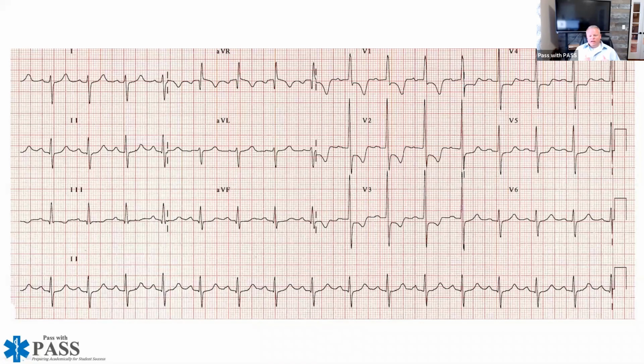So if I were to give you this 12 lead EKG, or you make a run today and pick this patient up, what would you call in with? You probably would call in with, hey, I'm bringing you a patient that has some basic ST segment depression, telling me that I've got some hypoxia, or the patient's not getting enough oxygenated blood flow in leads V1 through V5. So this should raise your index of suspicion that I need to do something for this individual potentially, because depression, we know if we don't resolve that, is going to end up flipping up and becoming a STEMI.